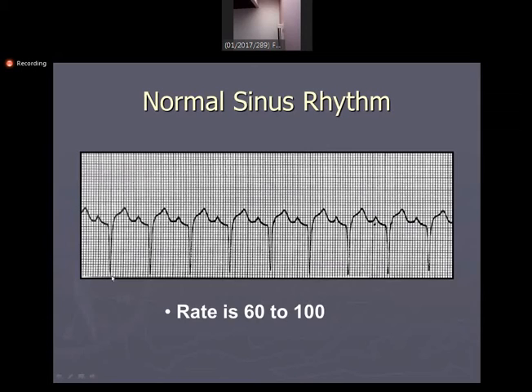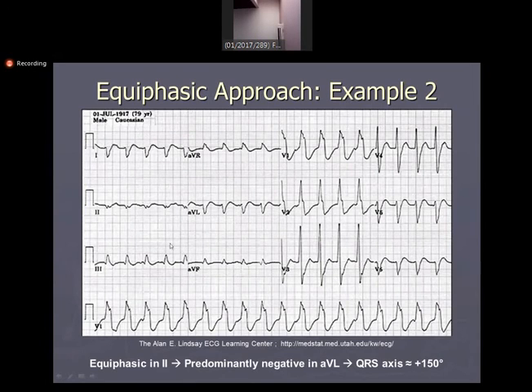That is 1 second. 1, 2, 3, 4, 5, 2 seconds. 1, 2, 3, 4, 5, 3 seconds. 4 seconds, 5, 6 seconds. This is a 6-second strip.